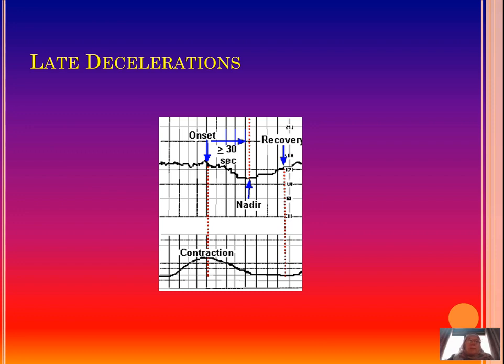It basically shows that during a contraction, the blood flow from the placenta to the baby gets interrupted, and in a healthy baby this can be compensated well, and you do not even see it on the CTG. Healthy babies cope well with this sort of interruption of blood flow. But in those babies that are compromised and have a reduced fetal reserve, you will find decelerations, because their compensation is delayed. It is very worrying if they show late decelerations, because this delay in coming back to normal after a contraction shows the baby is actually not well.